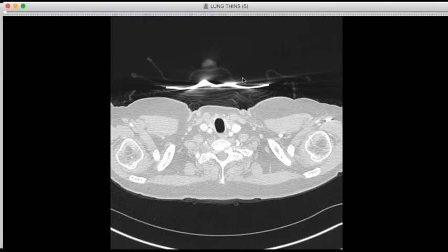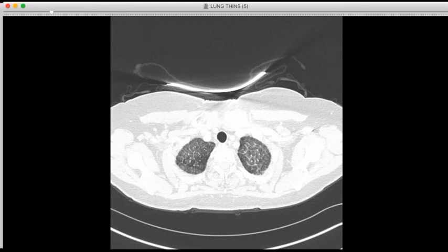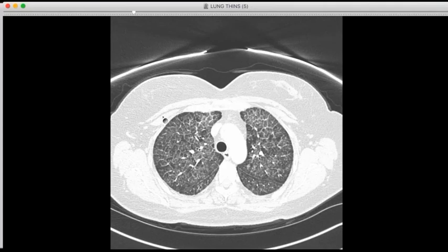Okay. So this woman works in a door manufacturing plant where she's exposed to plastics and aluminum. And she presented with a chronic progressive cough that was interfering with her work and annoying her coworkers. So I don't have her radiographs, unfortunately. This was an outside scan. And this is the right one here. But it was abnormal, so they did a CT scan.